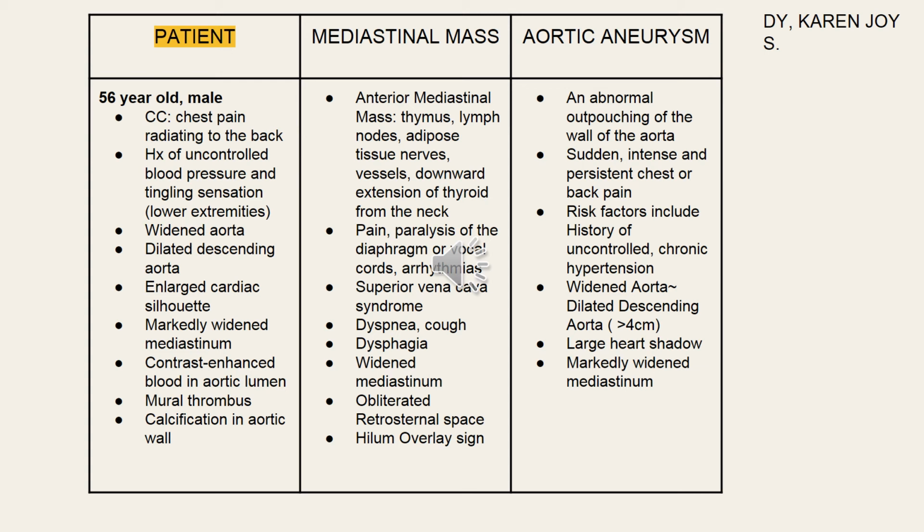It is important to note that risk factors would include history of uncontrolled and chronic hypertension. There is widened aorta, dilated descending aorta, large heart shadow, and widened mediastinum.